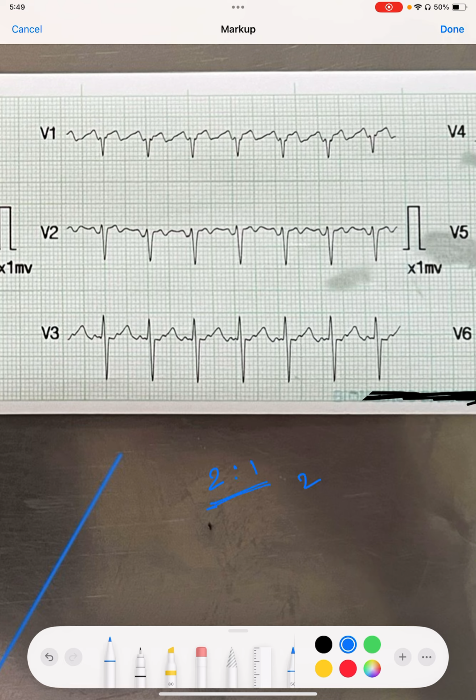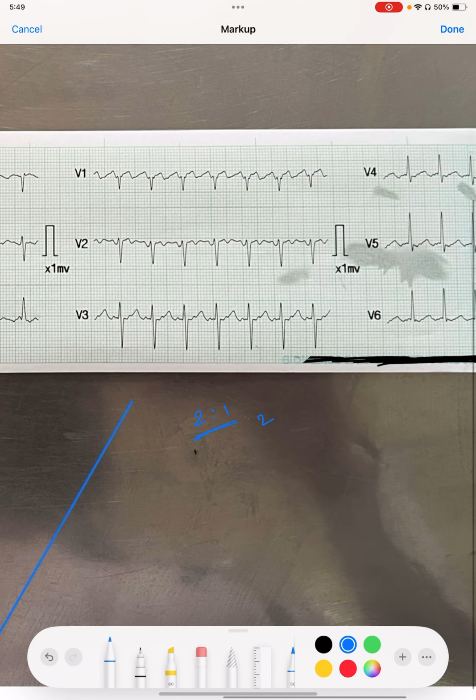It means there are two atrial complexes. The atria is contracting twice, and only then are we getting one contraction, which is the ventricular contraction. Usually this doesn't happen in typical SVT, AVRT, AVNRT. It is a very peculiar feature of atrial flutter, where the atrial rate may differ and the patient may have 2:1 or 3:1 or 4:1 or 5:1 block, or even more advanced block, or the patient may have varying block. Somewhere it may be around 2:1, somewhere 3:1, somewhere 4:1.